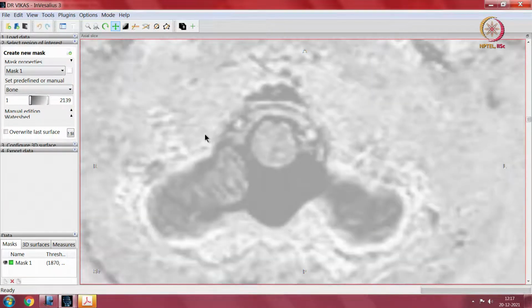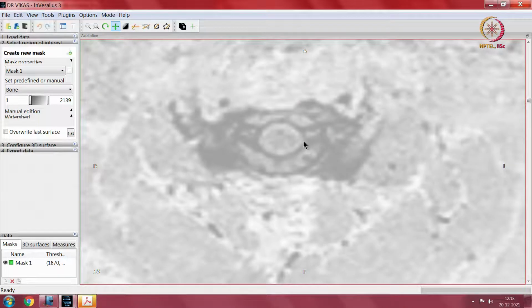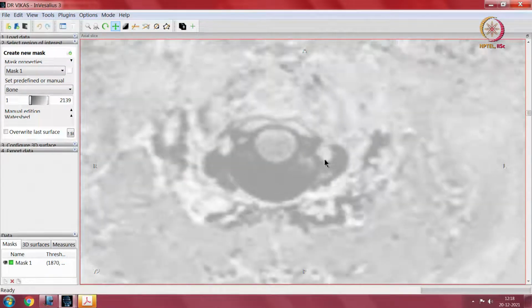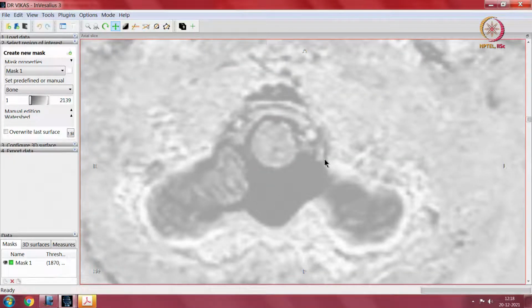Yeah, so this is lower down. We are again coming down, this is almost the neck, this is spinal cord. So, this white stuff is the spinal cord. You can imagine that its resolution is not adequate in spite of the kind of imaging technique. You can see the pixelations happening at this magnification. These are very high resolutions.